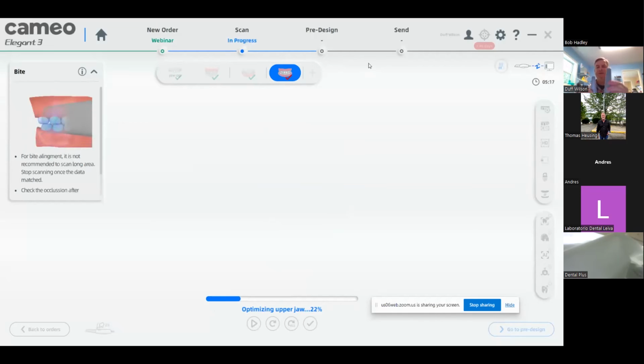And so this one is bigger, it's for adults, but this one's a smaller one for women and children. So if you can't open your mouth too big, this will do it. Of course, the smaller one just has a little bit smaller field of view, but I can say that it scans very well. The depth of view is the same on each one.